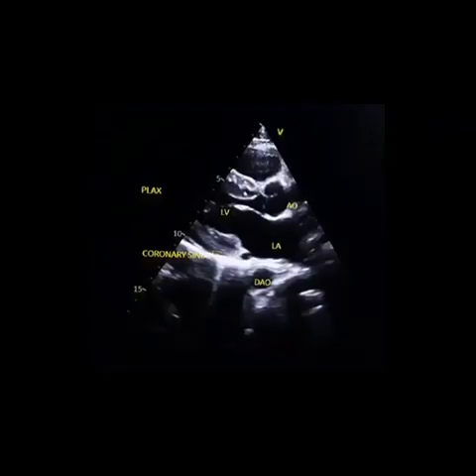Hello friends, we are going to study today coronary sinus.